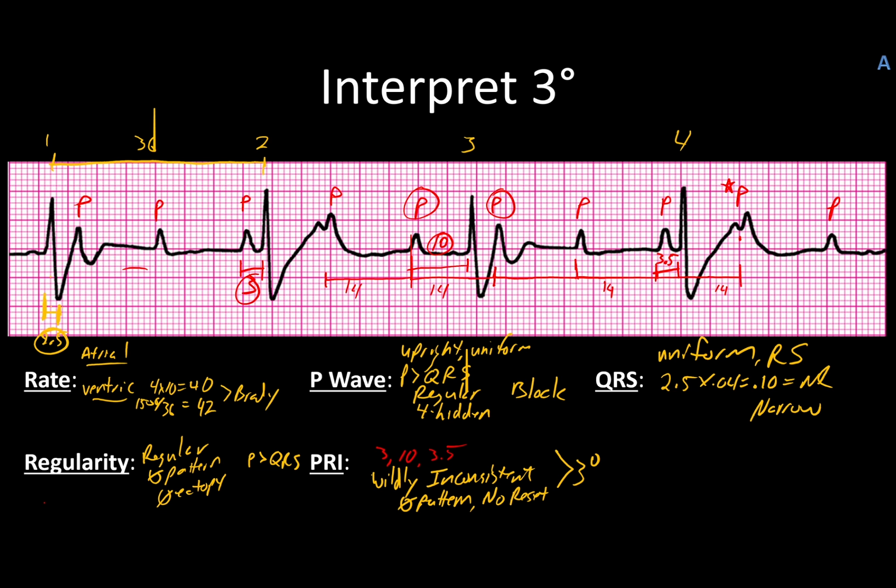Even though there's that wide slur that occurs, that has more to do with the heart having difficulty repolarizing afterwards, and things of that nature. So to that end, we've got third degree heart block, and I will, just because we've been doing this in blue, I'll reinforce it.